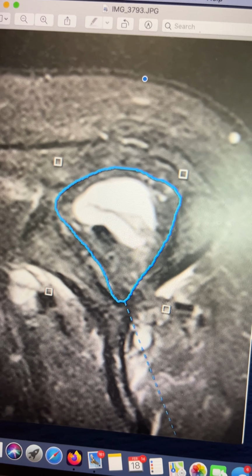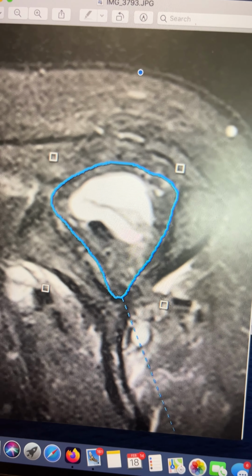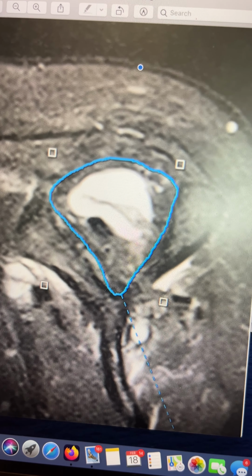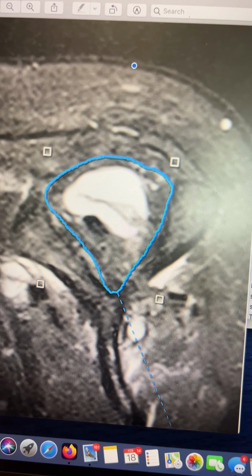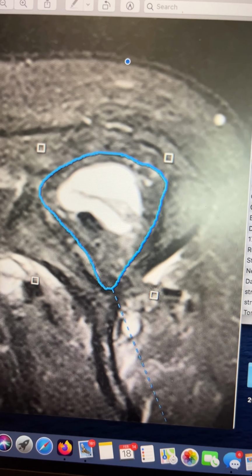So anyway, this is how we tell, and this is in real life. These are actually some images from the patient population that I serve, to give you an idea that this is not a fixable rotator cuff. So we've got to talk about doing something else. Hope this helps, and we'll talk to you soon.